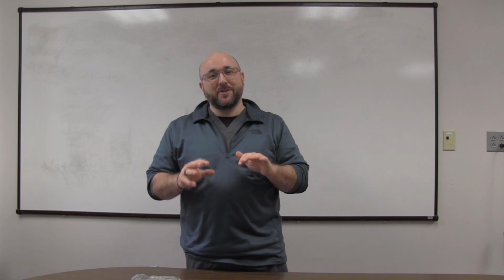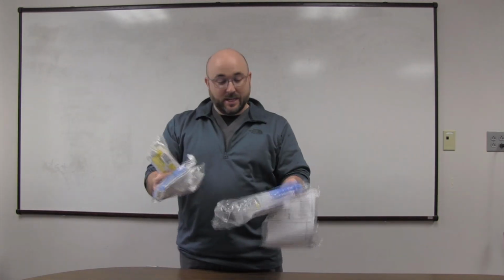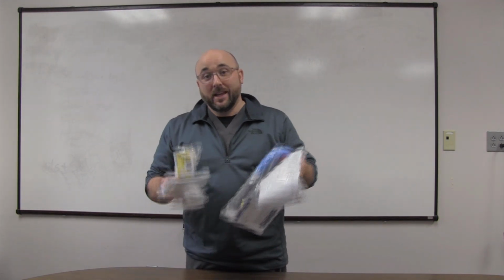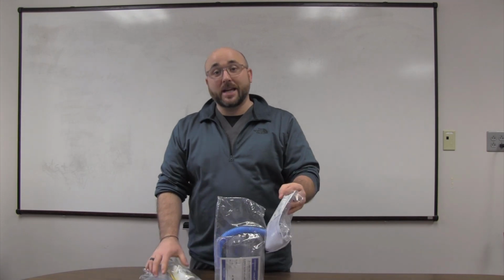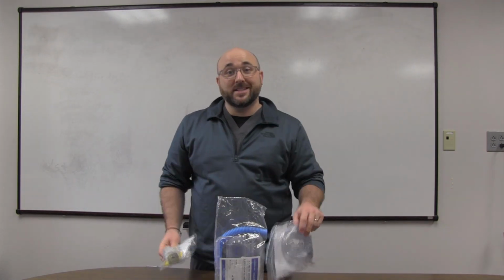Today I've got a cool video that is going to showcase a lot of respiratory devices. Now I've got 5 of them here. So I'm going to go through an explanation of what each one of these is used for, if you're teaching your patient how to do it, some quick notes on it. I'm going to link some videos up above while I'm doing this so that you can get a deeper explanation of some of these devices that you may see on your patient's bedside table.